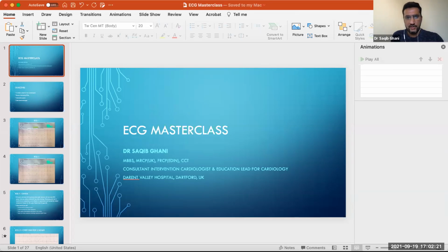With no further delay, I'm going to move to this first ECG. What I just want you to do is have a look at it. I've left the numbers on the top as they are. The audience may have very junior doctors, some more senior, some even better than me at reading ECGs, so I have to be careful here.